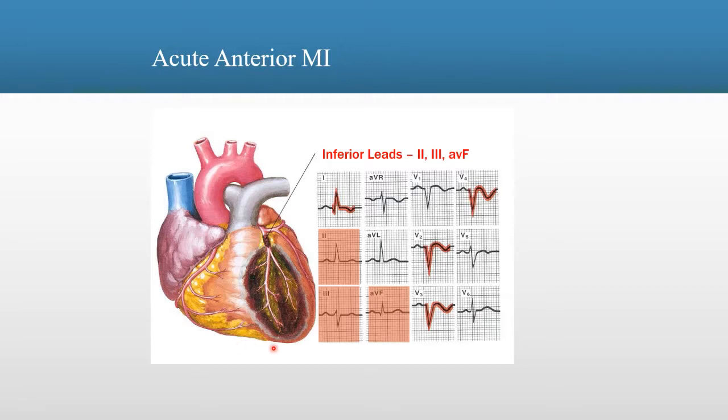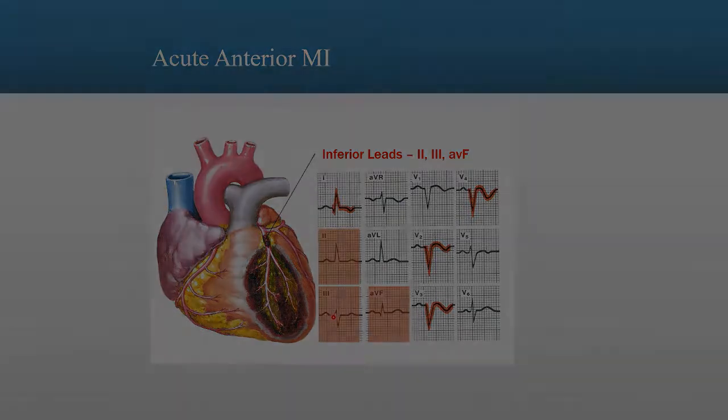When evaluating the 12-lead EKG, look at each lead. These are contiguous leads. In other words, they look at the same position. If 2 of these 3 leads show ischemic or injury or infarcted areas, this is significant and you should be suspecting that there's an injury here. Let's move to the next leads.